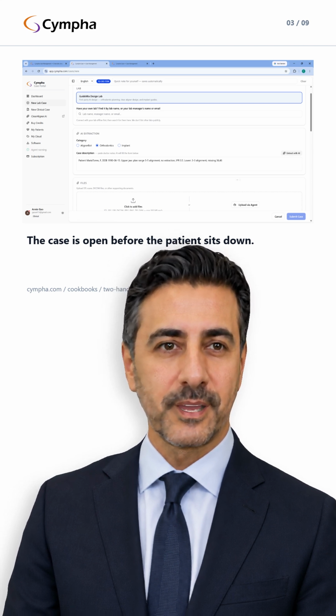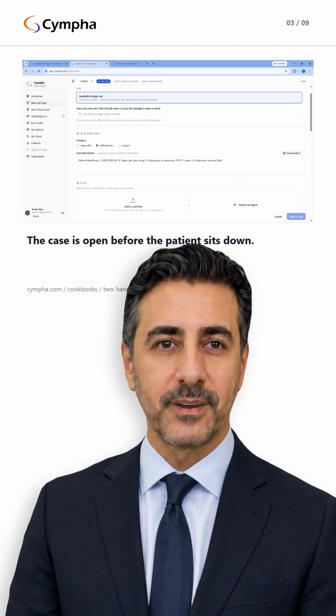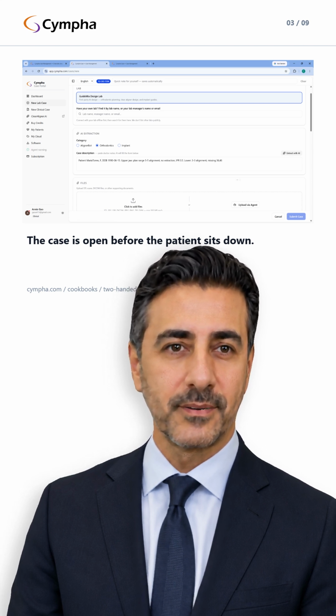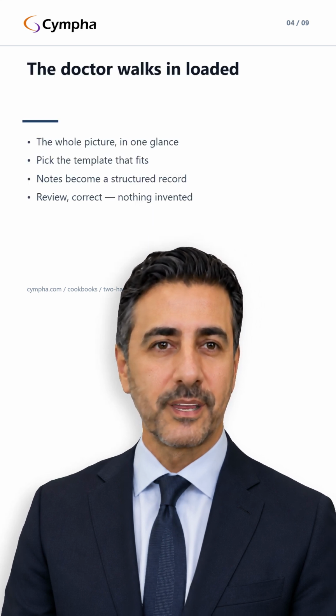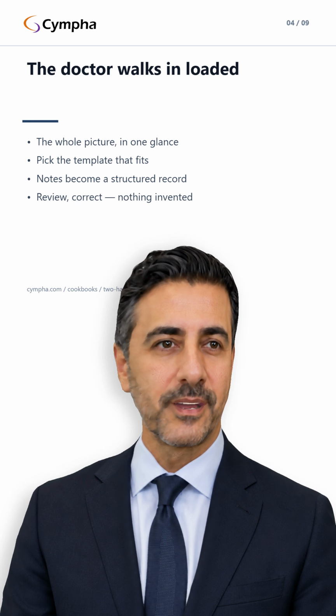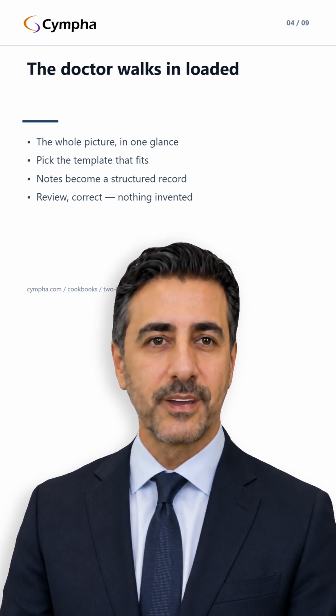It starts before the patient even arrives. Your assistant opens the case from the next name on the schedule. From that moment, the case is a magnet. Every photo, every scan, even a snapshot sent from a phone, all of it lands here on its own. Nothing to sort, nothing to attach by hand. Now the doctor walks in, and the whole picture is already on screen.